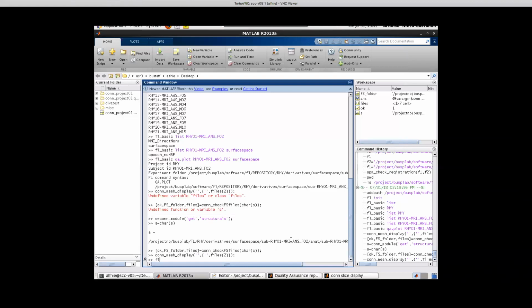We can go into more detail about what it would mean if we noticed that it looked okay in the subject space, but there was a bad mapping to the FS average space, what sort of things would lead to that, and whether or not it's something that we need to actually include in the QA plots. Because a lot of this, if you just run FreeSurfer's Freeview tool, you can look at all this stuff.